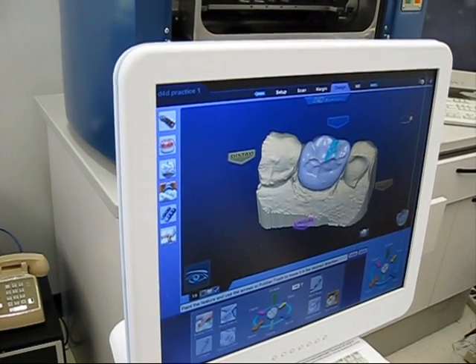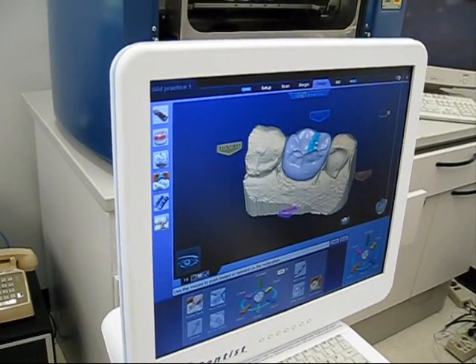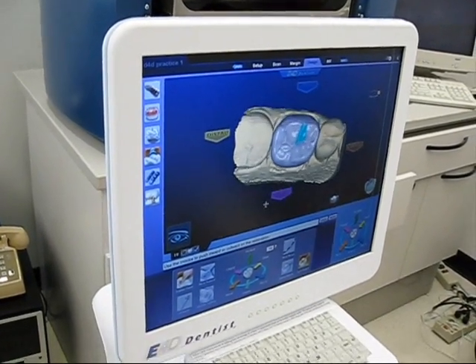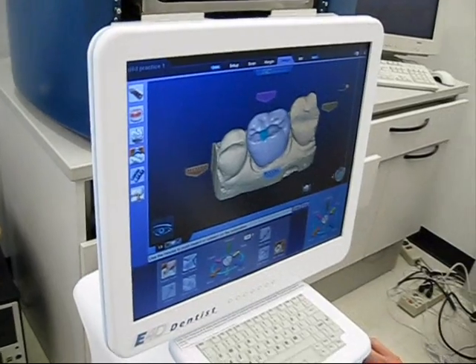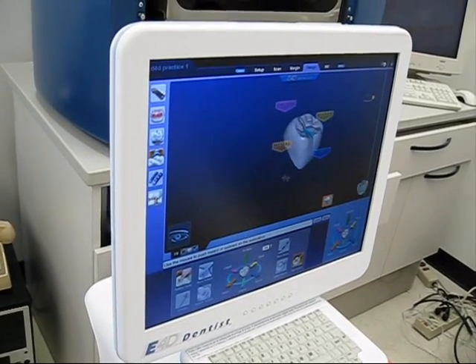Or if you just want to move a certain area, just paint that feature. You can just rubber tooth that area, so that's the only area of influence, which comes in handy. It's a neat feature. To me, it's very user-driven. You can turn off the adjacent teeth. It's the easiest way for me to make a fast adjustment.